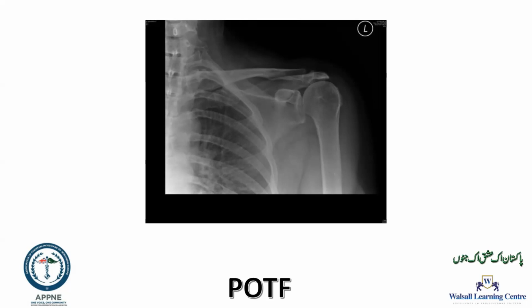Yes, sir. This X-ray shows an AP projection of the left shoulder. There's no fracture. So this is a skeletally mature shoulder of the left person. It's showing a high riding humerus. The humerus is not in the socket. Can you see that? And the humeral head has got no tuberosity. It's called auto decompression. The tuberosity is gone, right? And it is saucerizing the acromion, i.e., it is knocking the acromion. So it's got three features telling you that this person doesn't have a cuff.